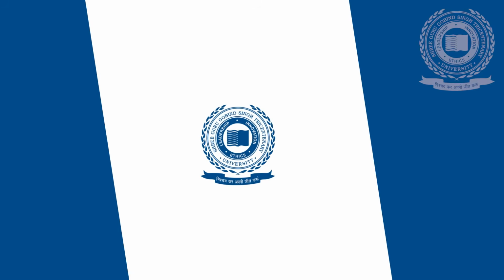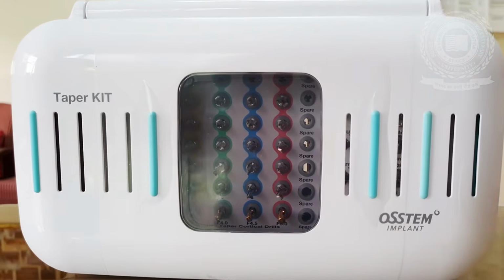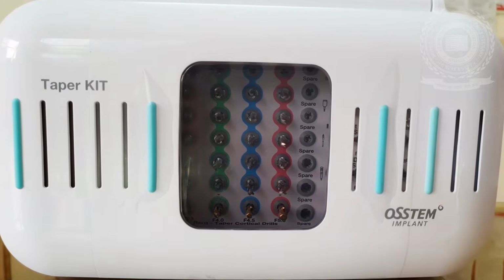Today, I will be demonstrating you all the components of a dental implant kit. Before going into details, we must understand that there are various dental implant kits available in market. So it is a choice of dentist which kit he wants to use.